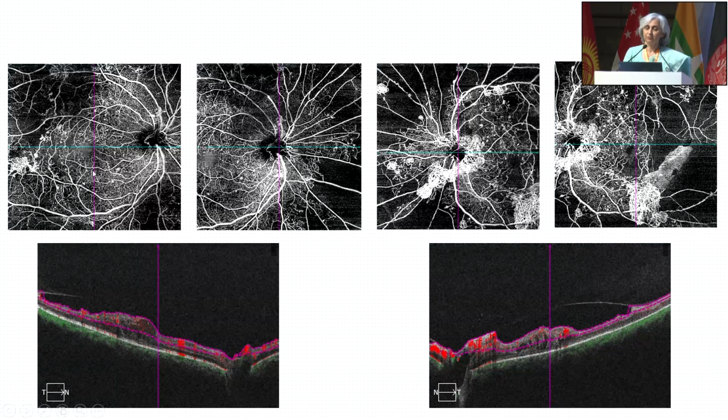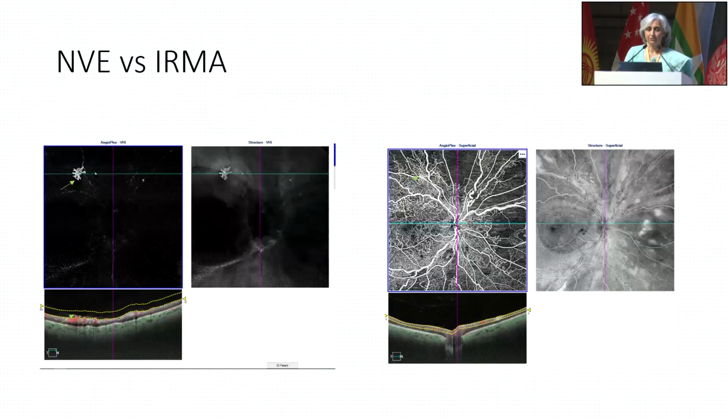And this patient with proliferative diabetic retinopathy, center it on the macula. You see neovascularization here, you see non-perfusion here, neovascularization of the disc. Center it on the disc and you see there's non-perfusion nasally as well. Similar in the left eye, and you also have the B scans showing that there's macular edema. So quick way to make your decision and explain to the patient.